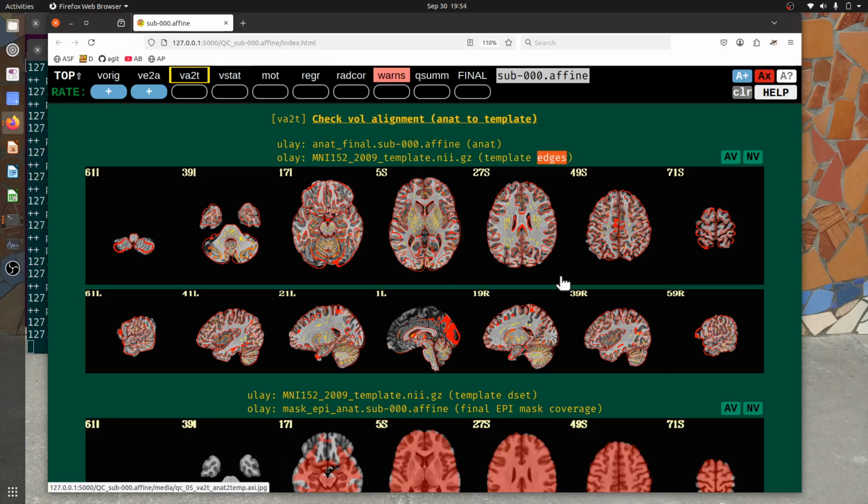If we did real processing and we had full nonlinear alignment for our processing, then what we might expect is that this alignment would be better quality. In this case, actually, I would say it is not great quality, but that is simply, in this case, one reason is due to there being a different subject than the template brain.